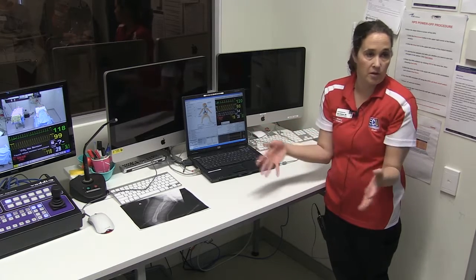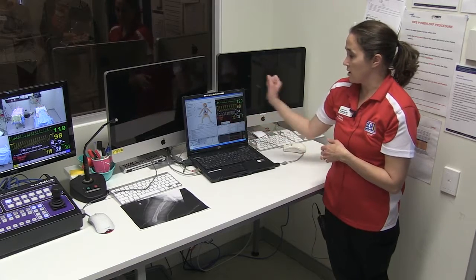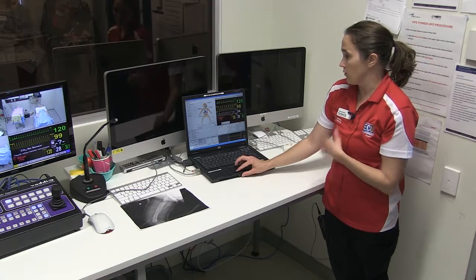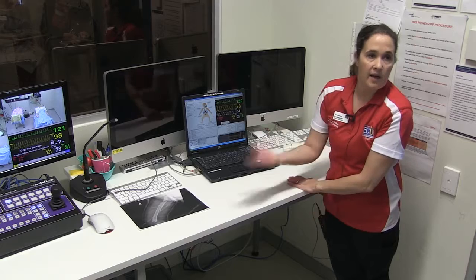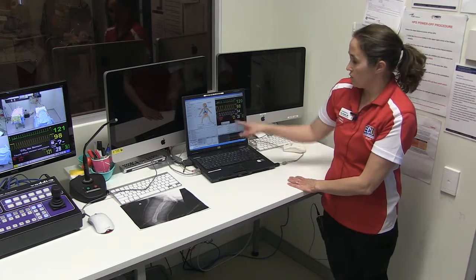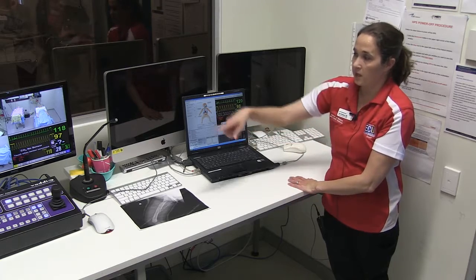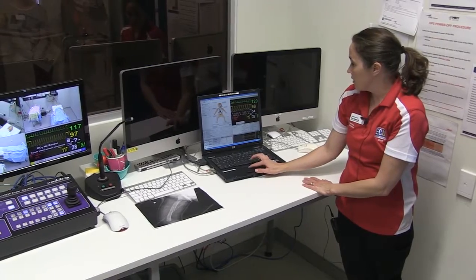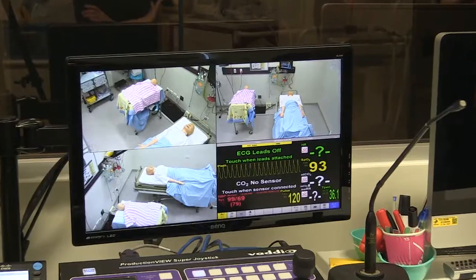They come into the room, they put the monitoring on, and you're setting the vital signs and everything, and you accidentally check the blood pressure. You've engaged it, and you don't want them to see that ahead of time, but you've accidentally hit it. There's no way to actually uncheck that one, if that makes sense, because every time you check it, it'll just initiate the blood pressure again. Whereas with the ECG, you can uncheck it, and you can see that it'll go off.